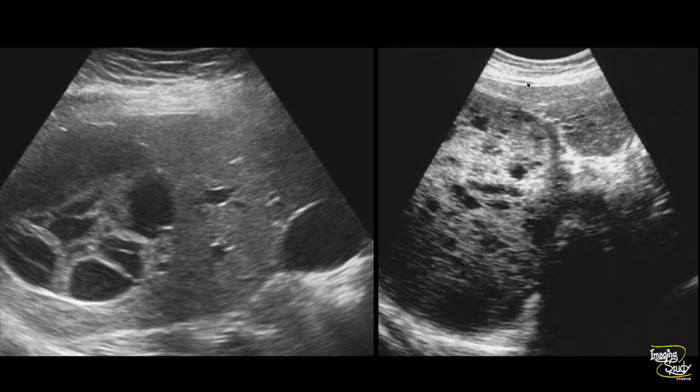On the right image, this patient had gone through a CT also. The cyst appears virtually solid on ultrasound because of organized clot, but there is enhanced through transmission. So you can see the distal part looks quite good enough. On CT, the cyst appeared more homogeneous, excluding the mass lesion.